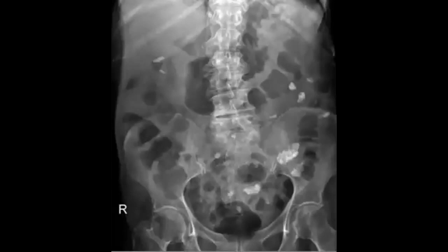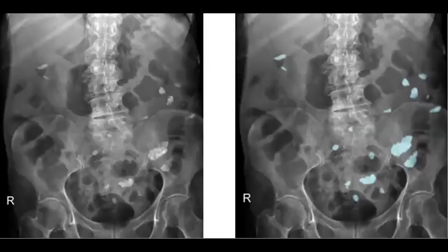So let's start with something like a review, and after that I will show you some more examples. So this case, if you would like to comment, I will wait for you in the chat. So, these calcifications. Yes, many suggestions, and one of the good suggestions is to think about peritoneal calcification, or also mesenteric lymphadenopathy.